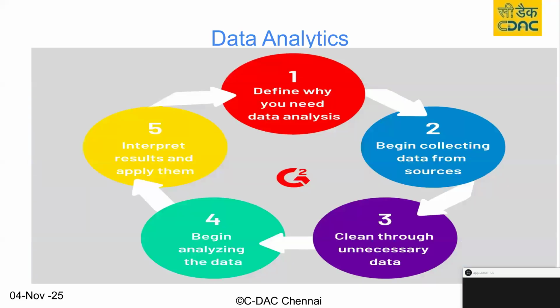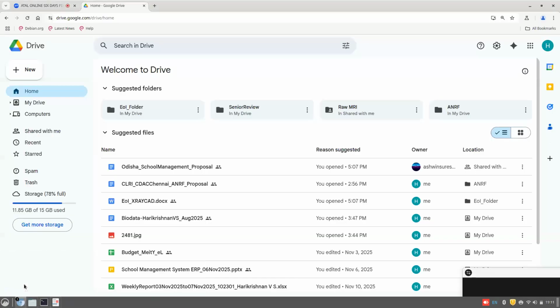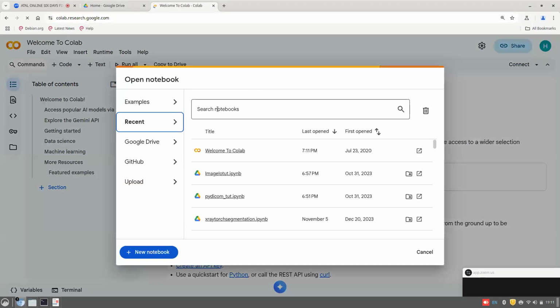As with any data analytics problem you might have faced, here also you need to collect the data. Then you have to perform necessary cleaning before analyzing or interpreting any results. So that's why I will take you to another Colab where the data cleansing is being discussed for the NIH dataset.